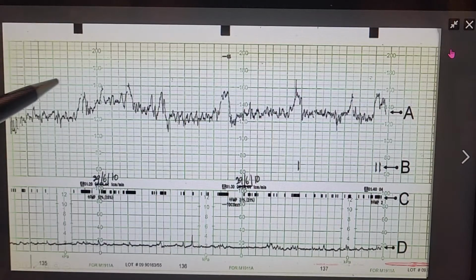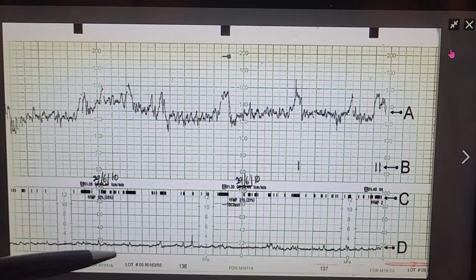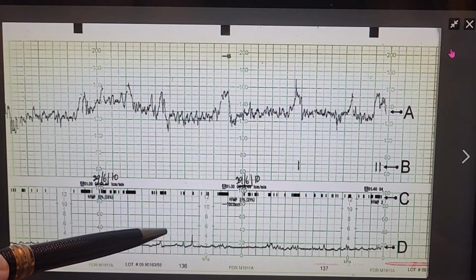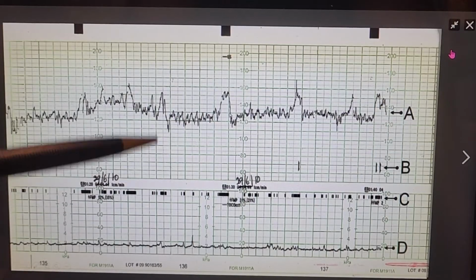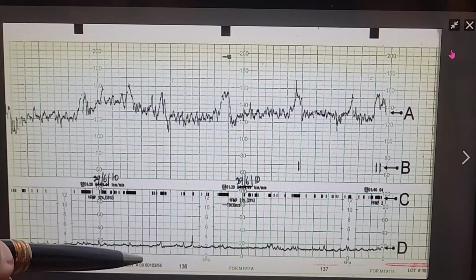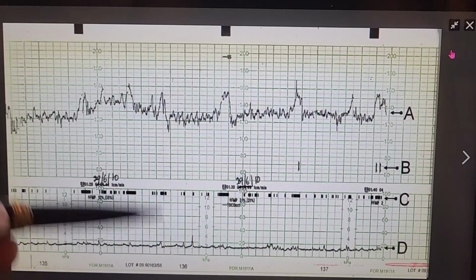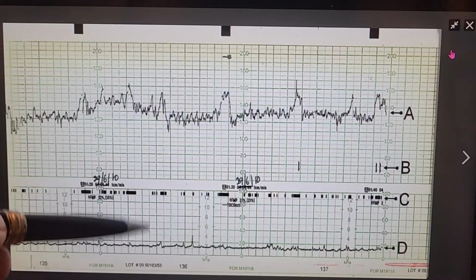where you have a sticker stating the patient's name and medical record number. And then here we have the lot number, or the serial number. And this number never exists twice. Meaning if there is any medical legal case, investigation, whatever, they cannot replace the serial number of a CTG with another from anywhere in the world. So they cannot have it twice, that's why.